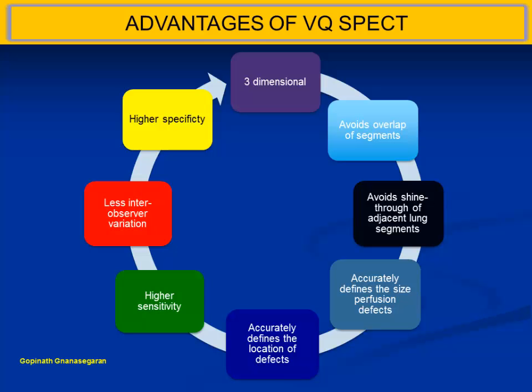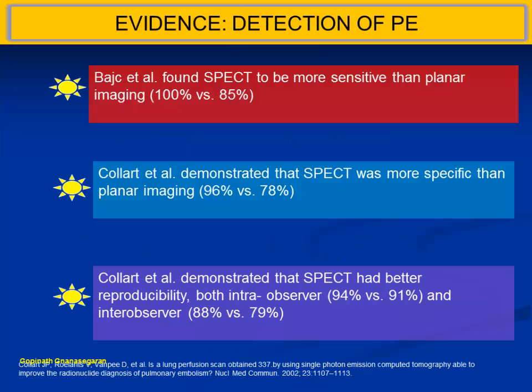Though around 10% of patients will have complications from thrombolysis, you should not take that as a guideline. If it's a single defect, you should not say it's unlikely to be PE. You have to take the clinical probability into consideration and phrase it accordingly. So if it is a long haul flight and the patient has a single subsegmental defect, then according to the EANM criteria it is not diagnostic for a PE. But if you have two subsegmental unmatched defects, then it should be taken as PE.